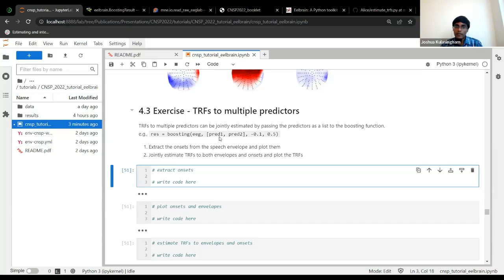But when you call them together, in that iterative loop, it's going to check which small change to which predictor improves the error the most, and it's only going to make that change. And then it's going to keep doing that until the error doesn't improve. Okay, so I suppose if you have predictors that are completely uncorrelated and independent, then they should give the same type of result. But especially when you have correlated predictors, this is much better.